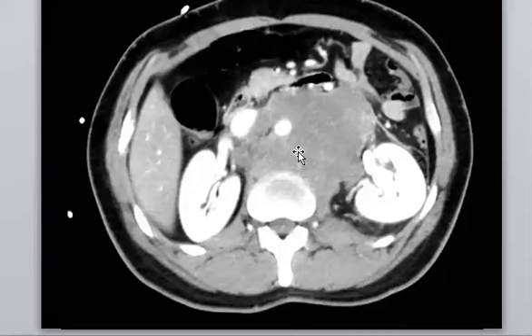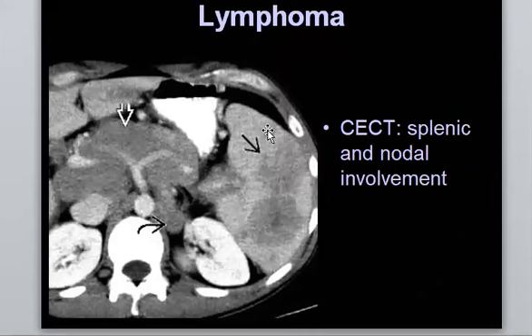So what you are going to do, most of the clinicians, they go for FDG PET-CT and they make an initial assessment, or maybe follow-up assessment. So don't forget to mention the regions of lymph nodes, especially the spleen, which is a tricky site for lymphadenopathy. And as you know, even in the staging of lymphoma, you have special staging for spleen, which is 3S, if it is involving the spleen.